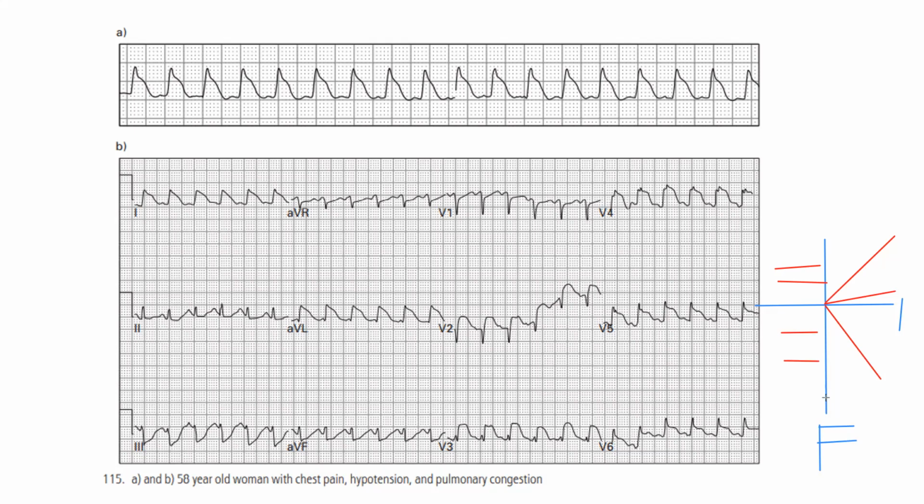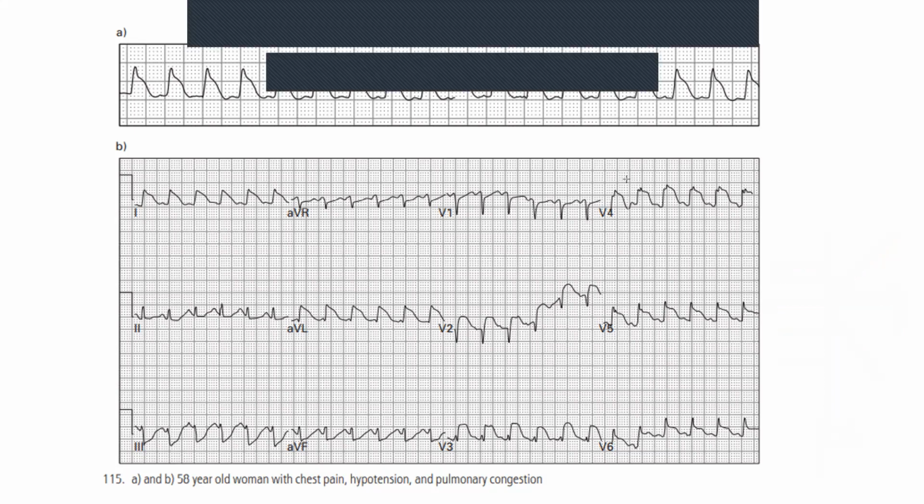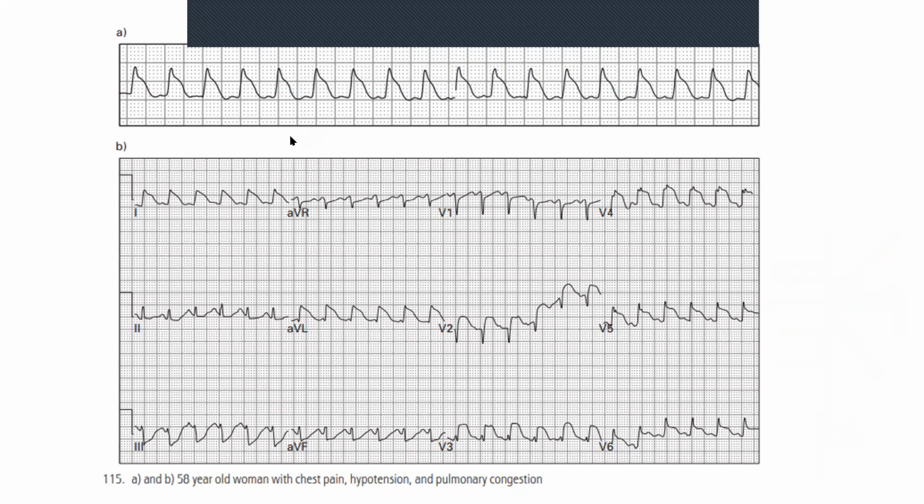So it's within normal. That does cut out quite a few things, such as valvular abnormalities and things like that, although the patient may have an early valve disruption, or a septal defect. There are quite a few things that can cause it, but we won't get into that now. So let's have a look at the rhythm strip itself.